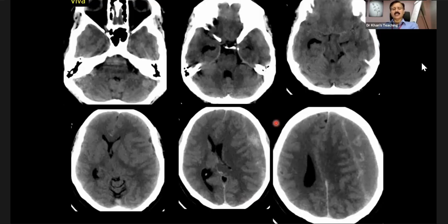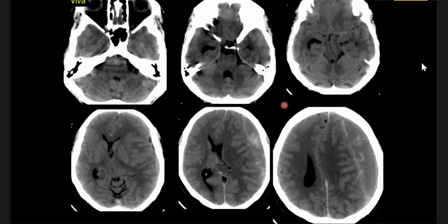So this is a case in which there is acute over chronic subdural hematoma, which is causing subfalcine herniation and transtentorial herniation. I want you to describe the findings to me, and I'm going to give you marks for your description. So there is a large left subdural collection along the convexity with midline shift to the right. There is a subfalcine and transtentorial herniation with effacement of the suprasellar cistern and the quadrigeminal and ambient cisterns. There is associated evolving hydrocephalus with ballooning of the temporal horns. And I think there is a small amount of hemorrhage present in the perimesencephalic cistern as well, on the first slide in the middle cranial fossa.